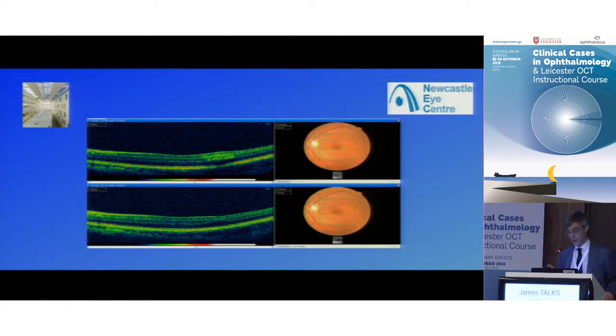If I look really closely, and I have to say this, I probably would not have noticed it, but if you do, that OCT is not normal. It's thin where that cotton wool spot was. So the damage from the cotton wool spot is still there, which I think is quite interesting. How you pick that up if you didn't see the cotton wool spot in the first place, I'm not sure. But people who get cotton wool spots do have permanent damage, which you can detect on an OCT and might, on rare occasions, explain why they have some visual scotoma. So I thought that was quite an interesting example.